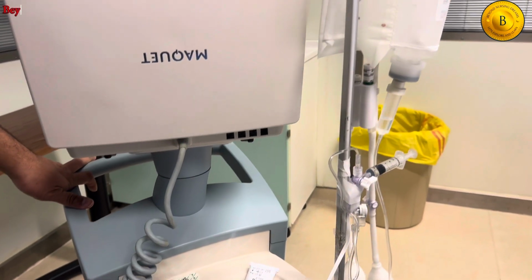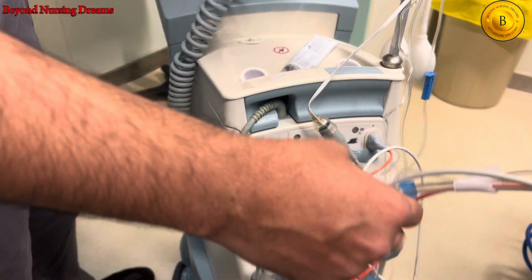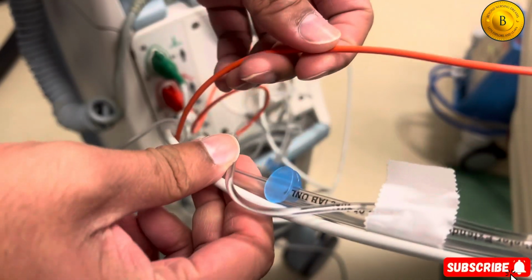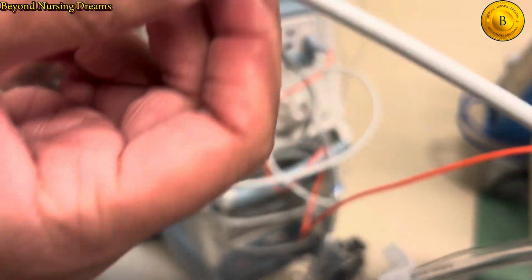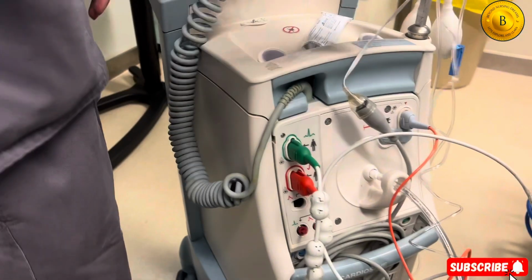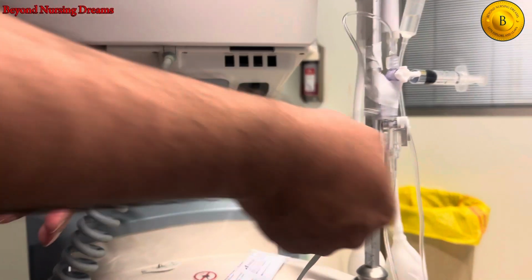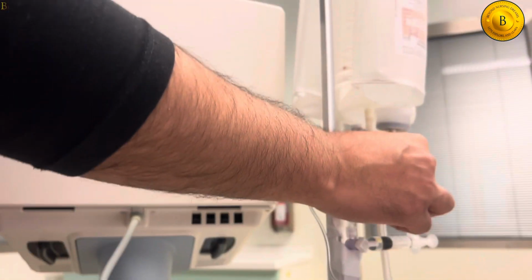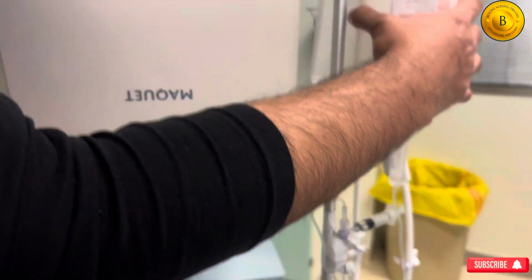Basically this is our CardioSave IABP machine, in which we are using the fiber optic intra-aortic balloon pump catheter. This one is our fiber optic cable. This one is our helium line. This one is our ECG line, the ECG cable. So we are connecting with one transducer. You are seeing this transducer here. One end is connected with normal saline with heparin solution, 1 ml, and then we keep pressure here.